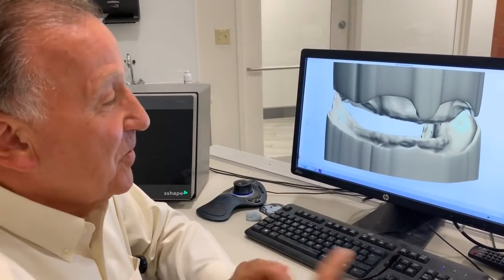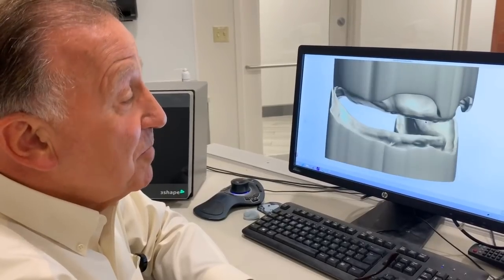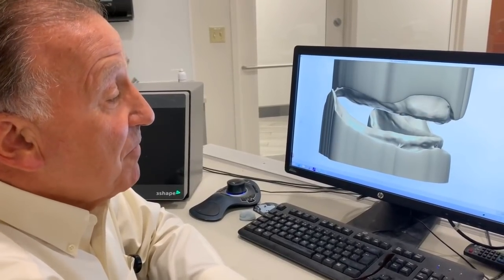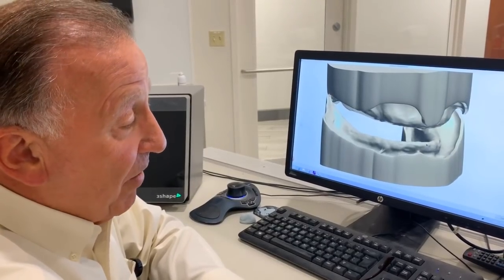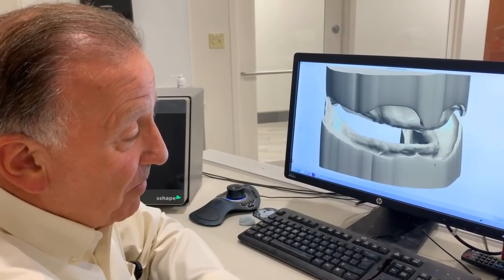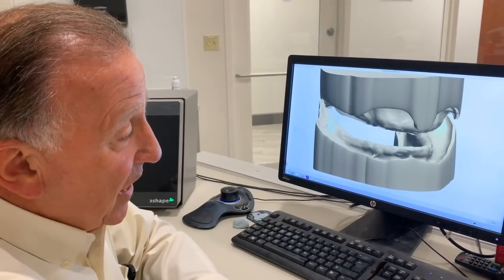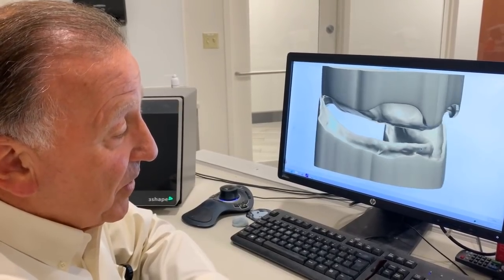Okay. Because your tissues have not resorbed. If this was, I hate to let you even think of this, but if 30, 40 years down the road, what you're seeing here would probably be, well, way down here someplace. Oh, wow. And same thing with the upper, maybe not quite as dramatic, but the lower is typically very, very dramatic.